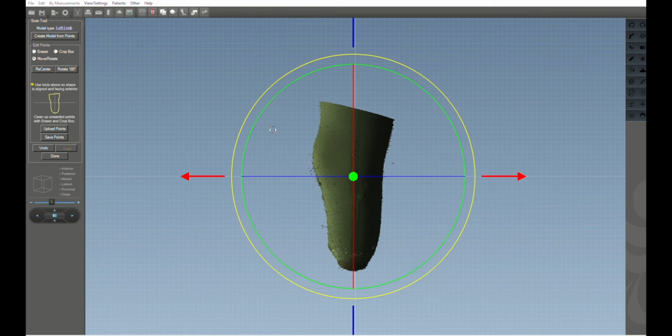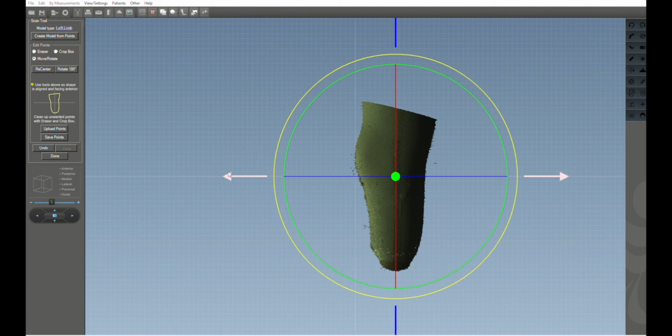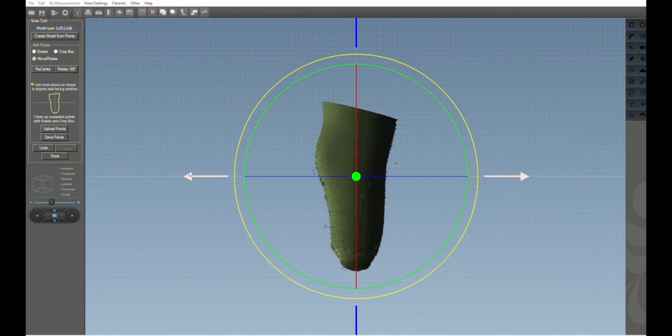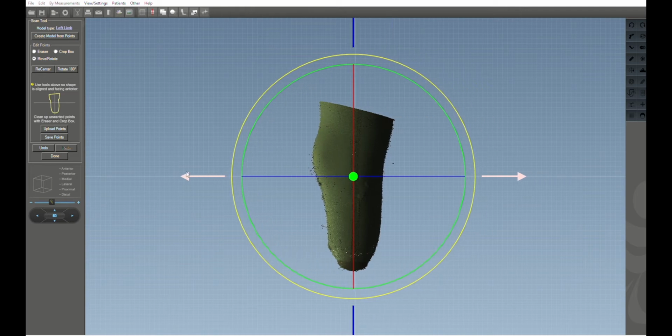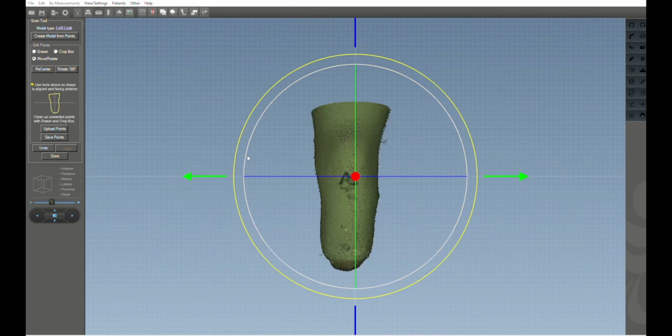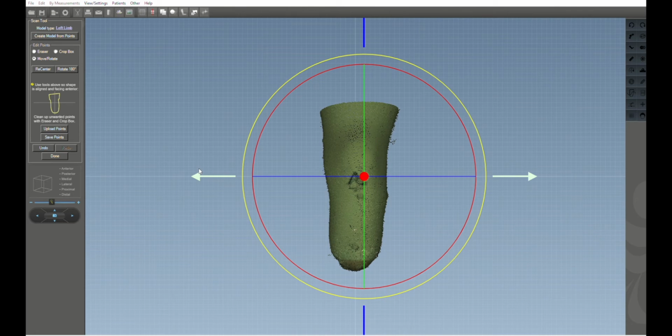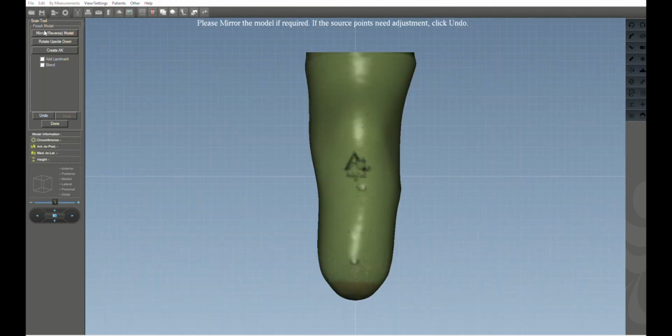As far as alignment goes, this white line through the screen, that's the center. So we need to make sure the model is centered over this. Let me move it over. So we're trying to center the model over this white line here on the screen. I just grab the arrow key, move it to the center, and do the same thing in the anterior view, and that's pretty good. And then I just say create model. A model has now been created.